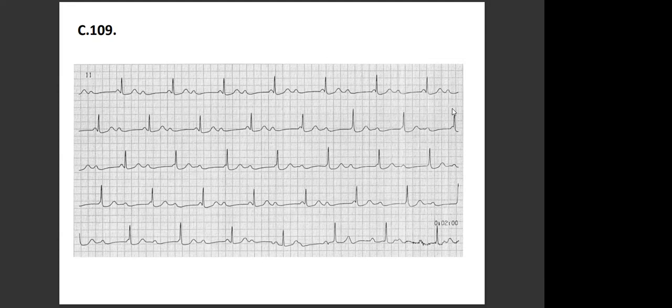It cannot be second degree for sure, because second degree means we do have arrhythmia, and that's not arrhythmic, that's rhythmic. You can talk about 2 to 1, but the only problem with the 2 to 1 is that the PR should be constant. Now let's look at whether the PR is constant or not.